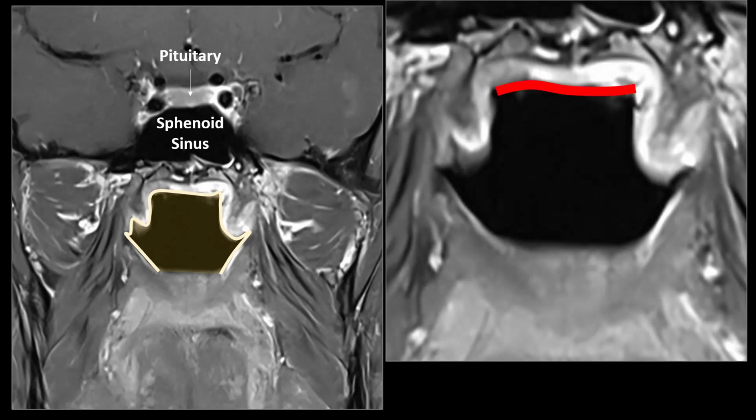We clearly recognize the roof, which is formed by enhancing mucosa located along the border of the skull base, and we have two lateral nasopharyngeal walls also lined with contrast-enhancing mucosa. The point of this slide is that the Torus Tubarius can also be recognized, this elevation, in coronal images because the Torus Tubarius slopes downward a bit.